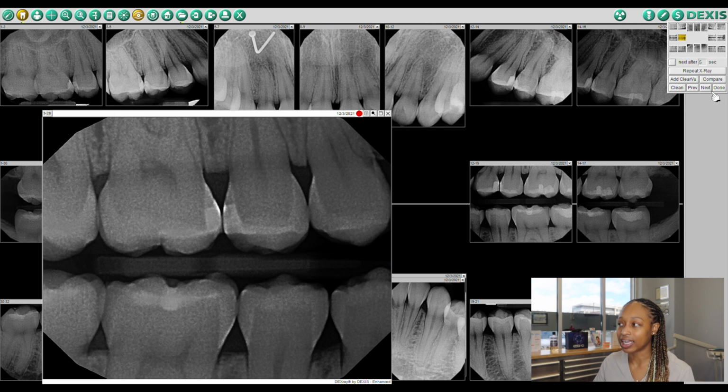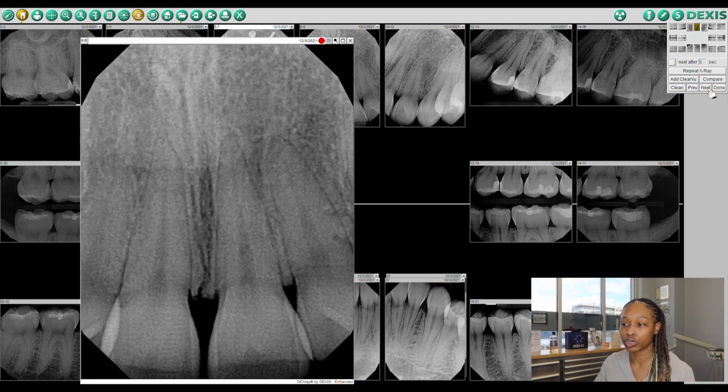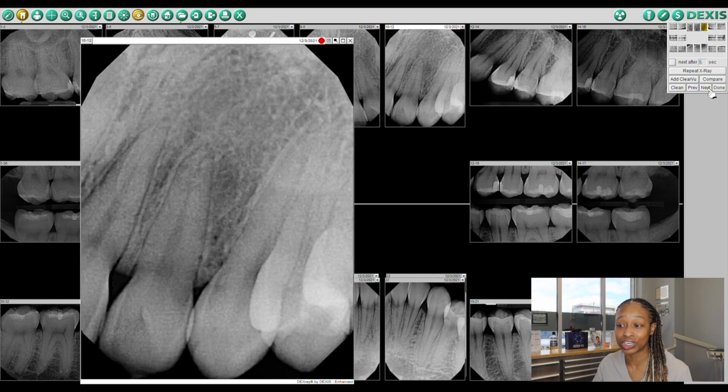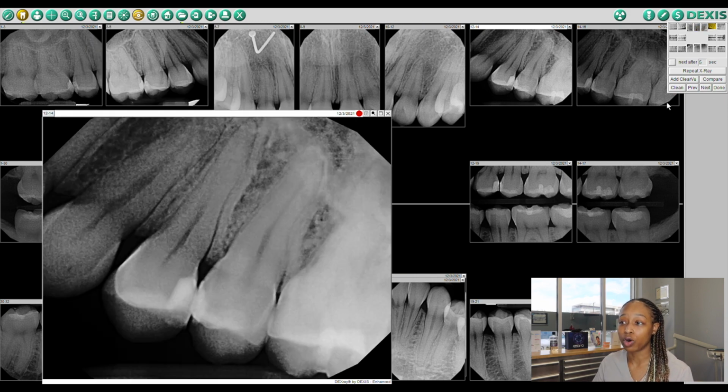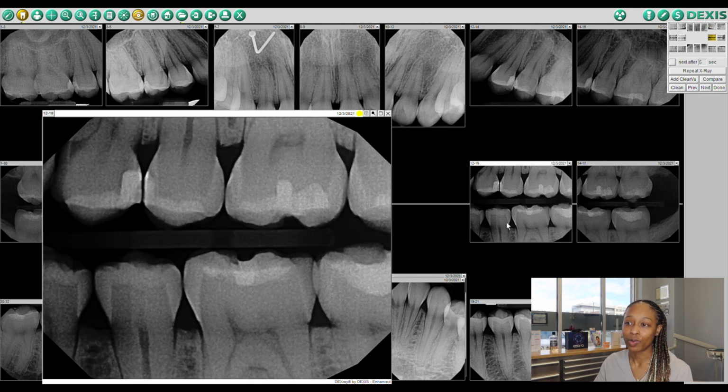Number 5 doesn't look like it has anything. And I just want to go up to the PAs of the anterior teeth. So just gonna go straight across. Doesn't look like she has any anterior fillings. Now we're over in the upper left. It does look like number 12 has a DO right here. You can just tell from the different color of the material, and if I drop down with the bite wings, you'll be able to see it a little bit better because it's angled differently. So 12 has a DO.